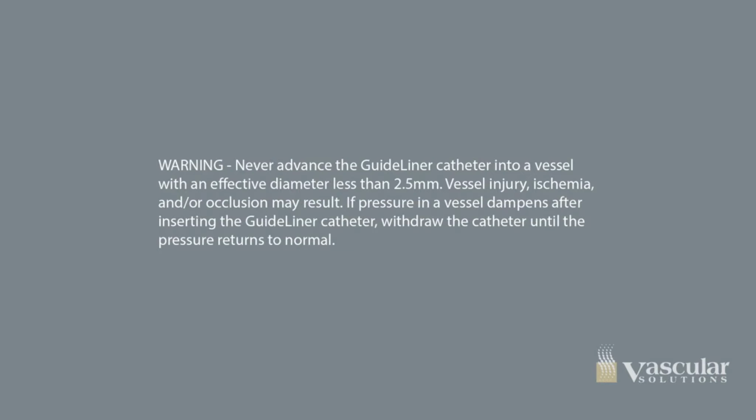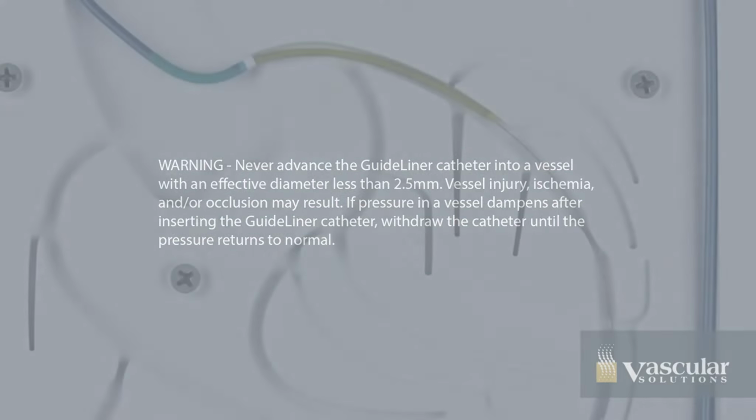Warning: never advance the GuideLiner catheter into a vessel with an effective diameter less than 2.5 millimeters. Vessel injury, ischemia, and/or occlusion may result. If pressure in a vessel dampens after inserting the GuideLiner catheter, withdraw the catheter until the pressure returns to normal.